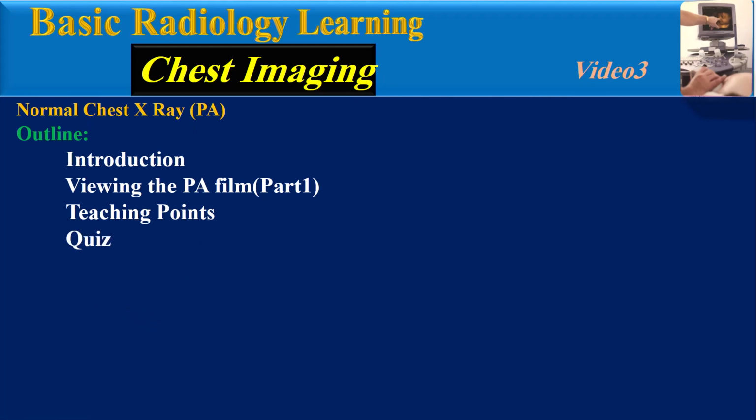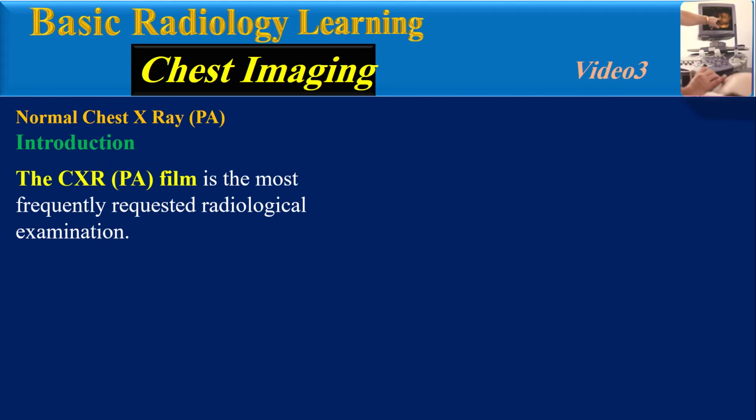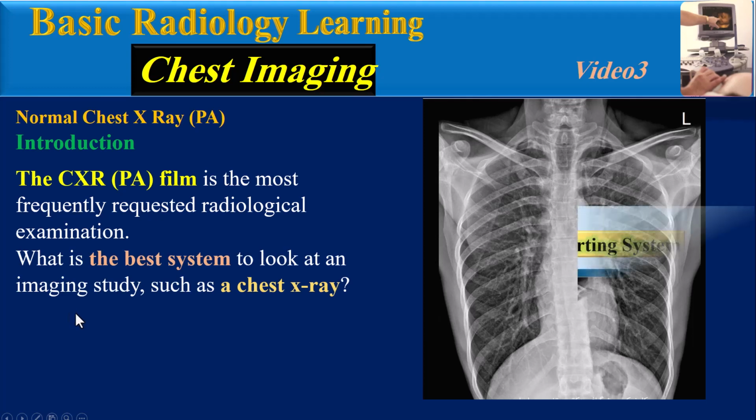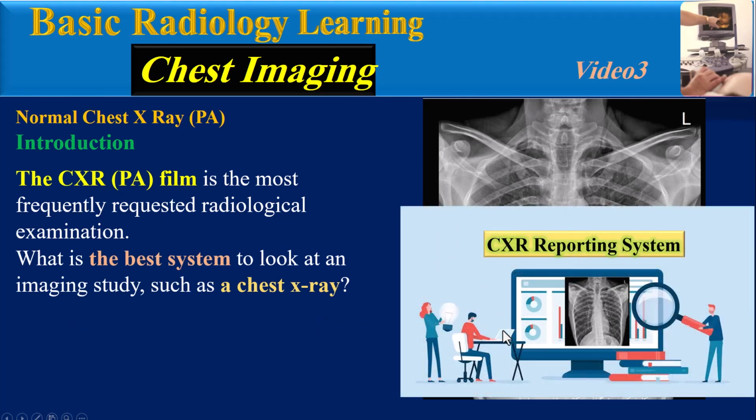At first, introduction. The chest X-ray posterior anterior film is the most frequently requested radiological examination. But there is always a very important question. What is the best system to look at an imaging study such as a chest X-ray?